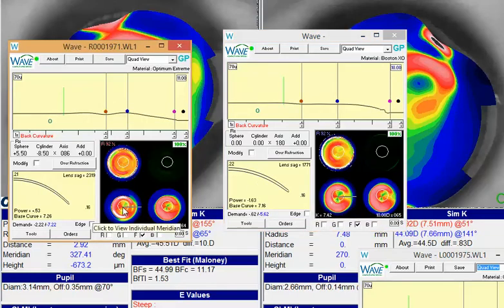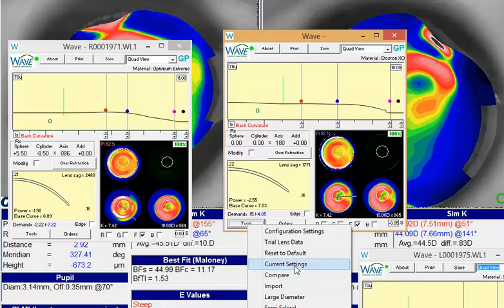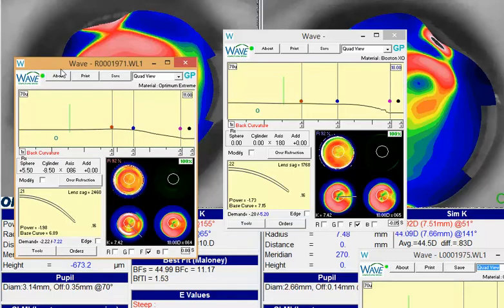And in fact, what you can also do, if you click on that little aspheric design, about 05 in the bottom there, and redesign it, sometimes that'll even get you a little bit nicer contour. In this case, I don't think it makes that big of a difference, but you'll see now that lower left-hand corner, which is the back surface of the lens, almost perfectly mirrors the topography that you were able to accomplish when you're capturing the corneal images. So this will give you a lens that has a better fighting chance of lining up.